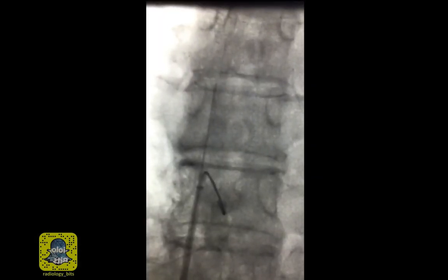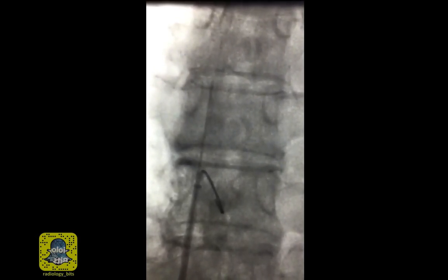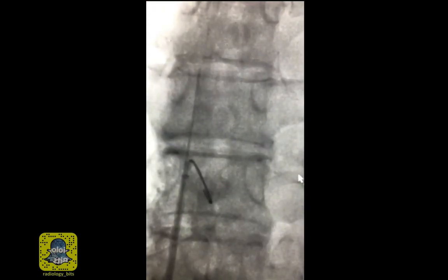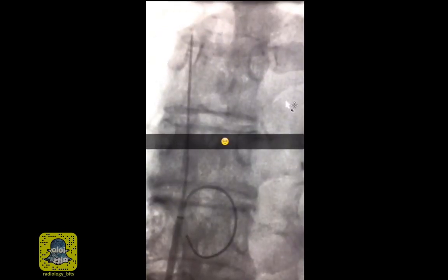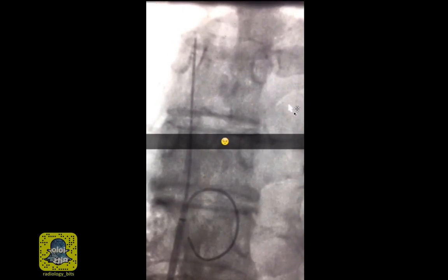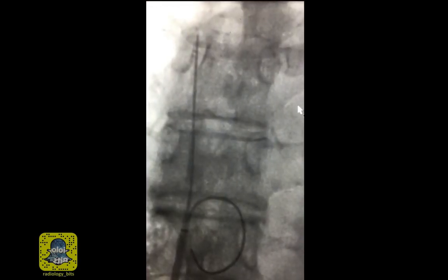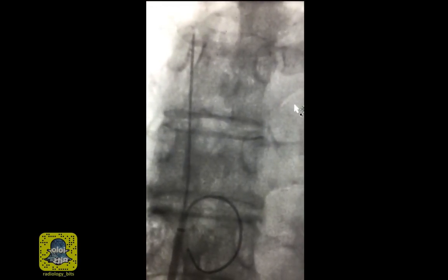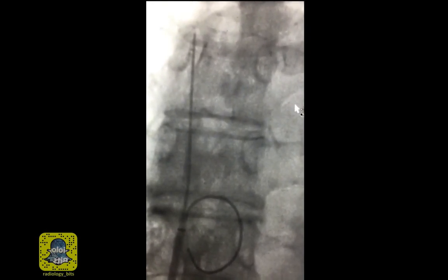Fifth, an interventional radiologist or cardiologist could actually snare such an abnormality, hopefully with ease. Such a simple procedure would save the patient major surgery in case it was needed. And finally, if you're inserting a central line or a PICC line and you use the guide wire, please take it with you. If you're doing your first interventional procedure, the first thing that the staff would teach you is to be very careful with the guide wire.